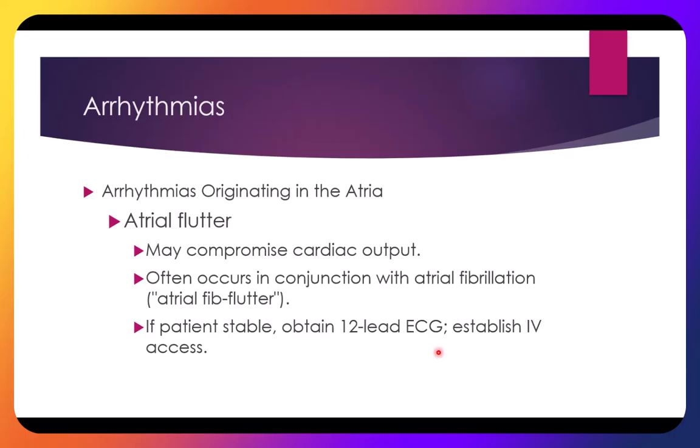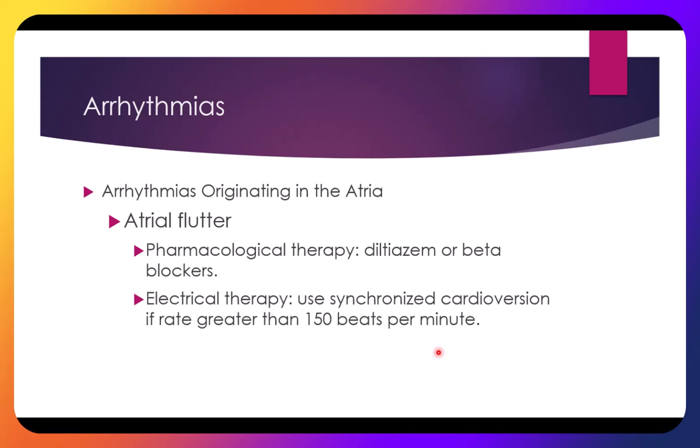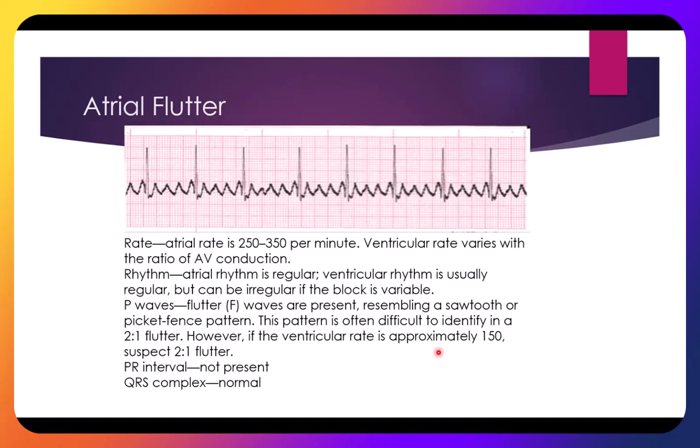Now, the big problem with atrial flutter is that it has a tendency to result in really, really rapid heart rates, which basically compromises your cardiac output and reduces it. Again, with these patients, we can see that atria firing, and then occasionally things get through. Now I'm going to skip this one because it's regarding treatment. Let's go to our 5-step method.